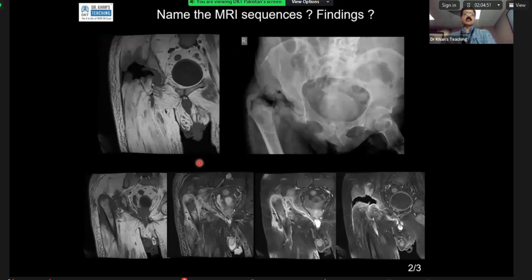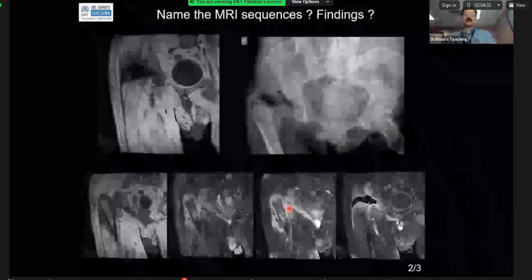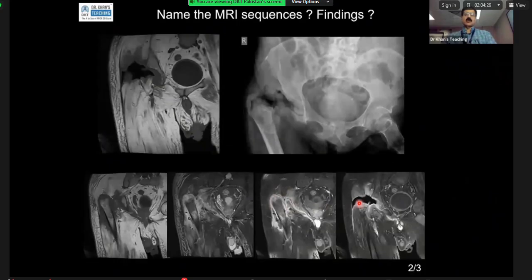Now, on this MRI scan, this is a T1, this is a STIR, this is post-contrast. And we can see the same findings. The air, of course, is low signal on this post-contrast as well as pre. On post-contrast, we can see this enhancing phlegmon. And here, of course, there is no fluid, there is air, surrounded by high signal or enhancement. But the key finding in this case was that there was air here and there should not have been any air here. Well done.